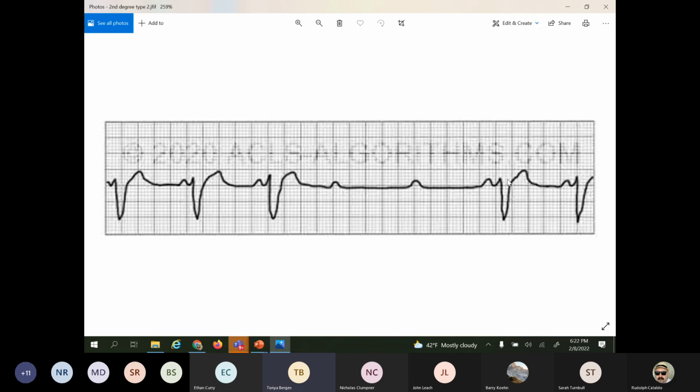You have extra P's. Okay, your extra P waves. I'd agree with that. Now, I have extra P waves. Is this a regular or an irregular rhythm? Irregular. Okay. Now, look at my PR interval when I do have complexes there. What is it doing?